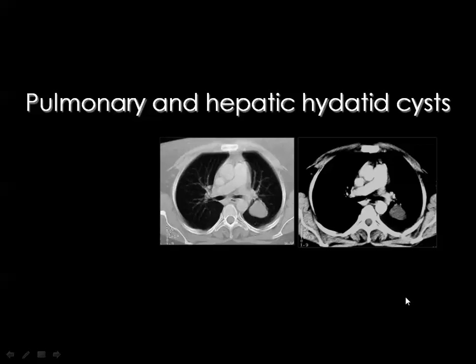The next nodule is the hydatid cyst, and I usually believe that the only water-containing lesion in the lung is the hydatid cyst.